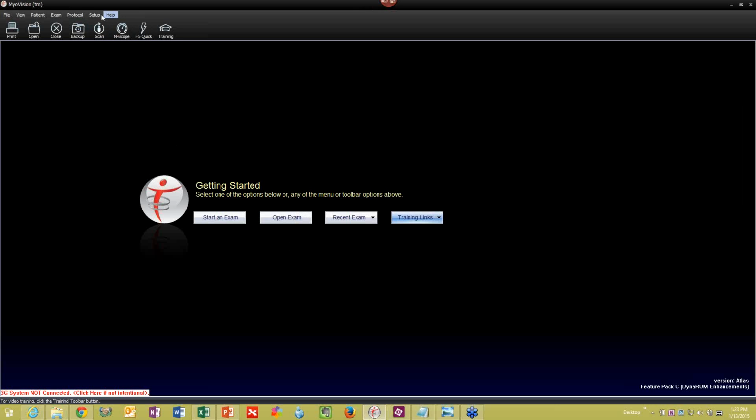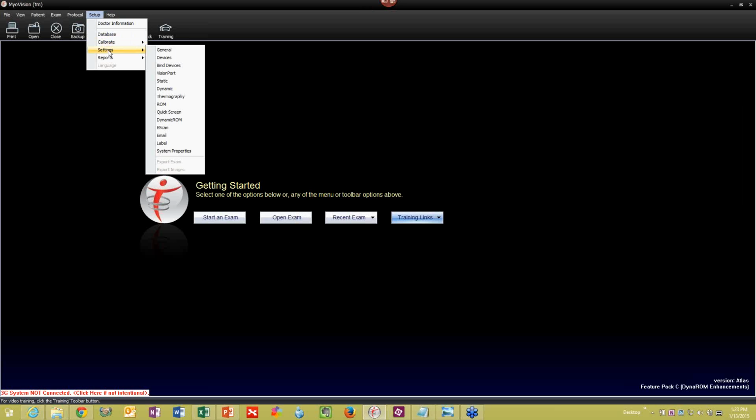We improved also the email part of it in that it works with all different email programs. It also reduces spam now because you put in your personal email address in here instead of the generic one, and then it reduces the probability for spam.